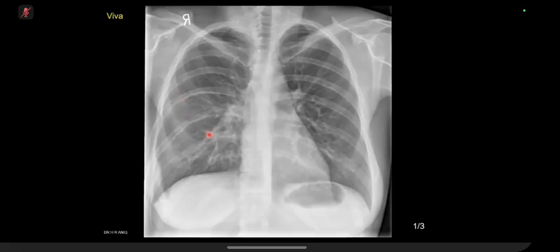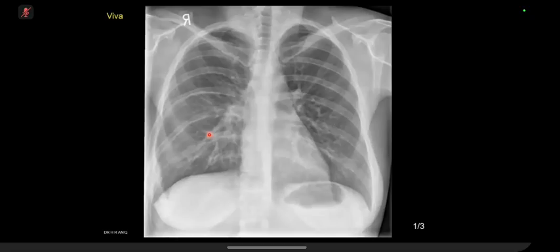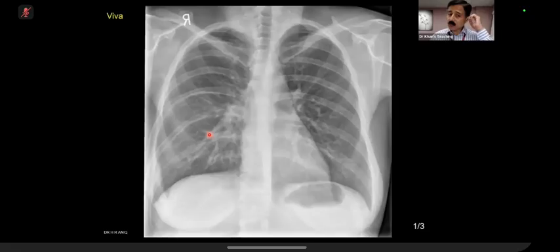And they look actually quite widely spaced compared to the adjacent ribs either side. That's good. Very good. I think there might be a chest wall mass that's splaying the ribs and causing some reactive sclerosis. So I am going into a differential diagnosis from your chest wall, which is classical for your exam. And this is what? Heading of the differential? Rib splaying? Inferior rib notching. Oh, notching. Okay, yeah. Absolutely classical 2B film, where you can see that there is rib notching here, there is rib notching here. You picked up this thing very well.